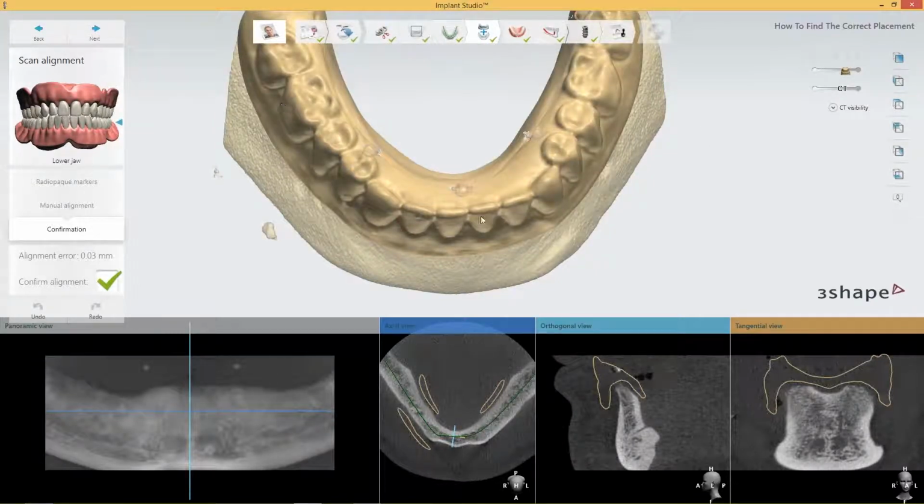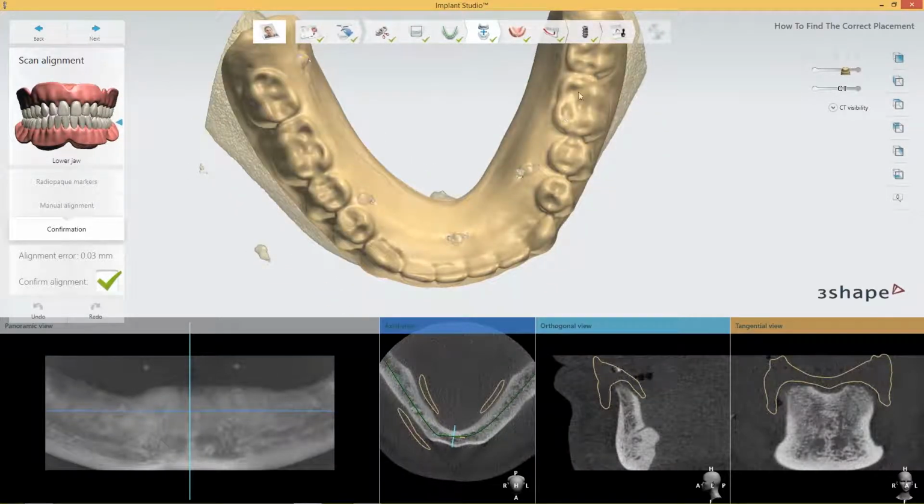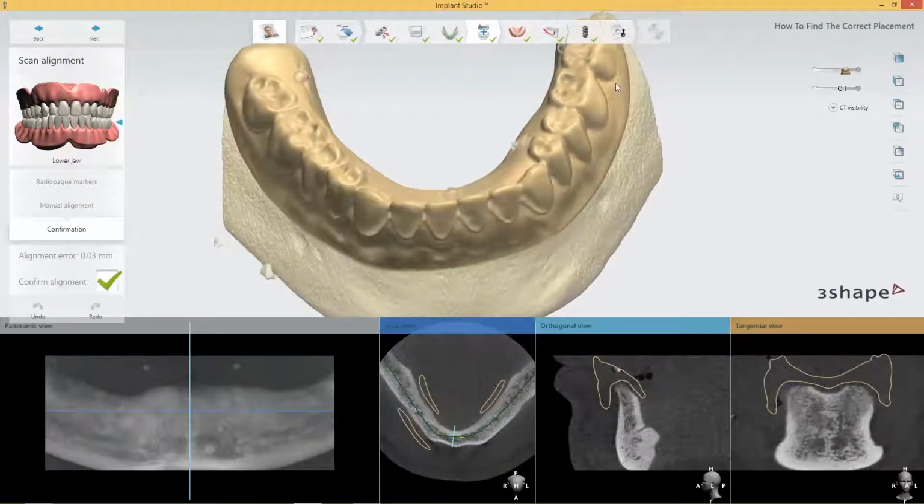So if you have a denture, you can use that. Otherwise, you can just make a wax-up or print it on the new 3D printer you have bought, maybe. Because you're going to buy a 3D printer anyway, because you're doing surgical guides. So maybe you can use it for this too. Here we can place the implants according to the planning that we are getting from the laboratory. So, dual scan protocol.